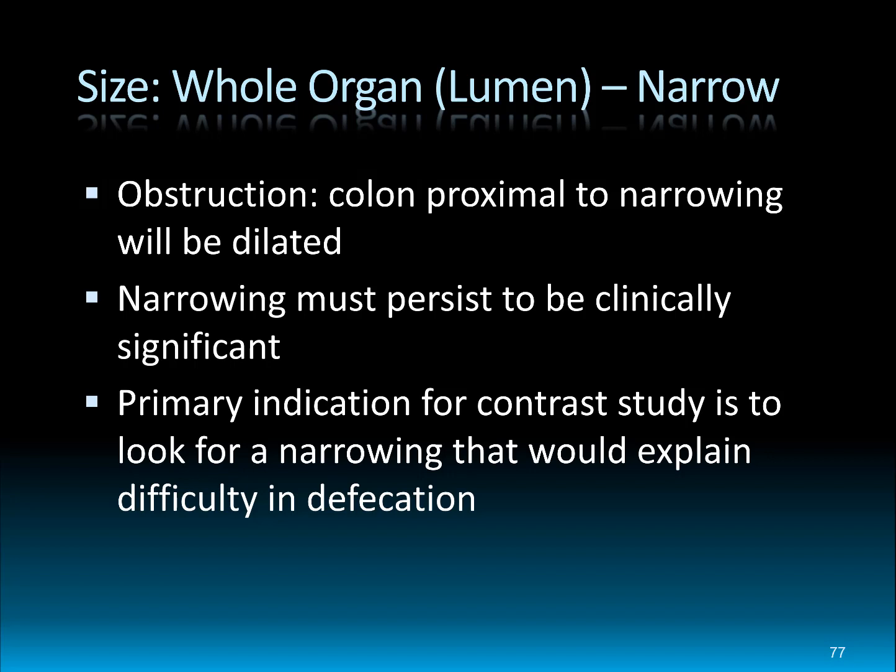And when you see that on survey radiographs, that would be a good indication for going ahead and doing a positive contrast or possibly negative contrast study to confirm that there is truly a narrowing there, whether that's a mass or a stricture, to explain the failure to defecate. So in this cat, we had such problems, and we did fluoroscopic evaluation of a positive contrast colonogram, or barium enema, and so you'll see that the color scale is reversed relative to normal radiographs. So here the contrast medium is black and air is white.